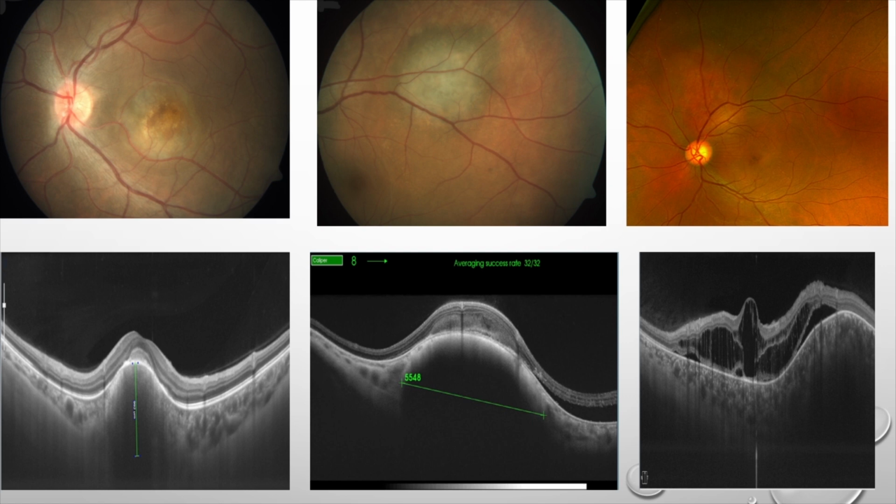Can anyone tell me what is what now? So now this is all in one go, so this is one picture which you can keep in your mind as an OCT presentation: when we are monitoring a nevus, how it looks. And the next one is a small melanoma, and this is a patient whom we have treated also. The small melanoma is treated post brachytherapy as well, the central one. And the last one is a hemangioma.